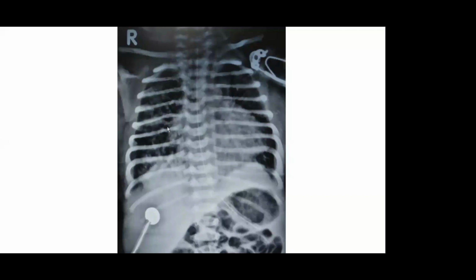Look at this: bacterial pneumonia or meconium aspiration syndrome? We really don't know. I've not given you any clinical details. So try to identify these opacities. Overall the lung looks hyperinflated. The cardiac silhouette is pretty obscured.